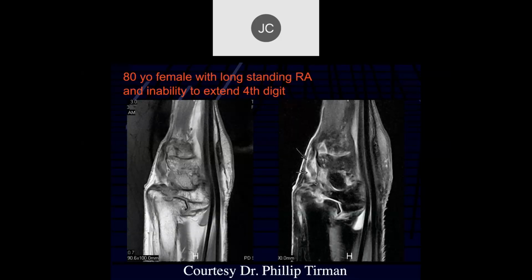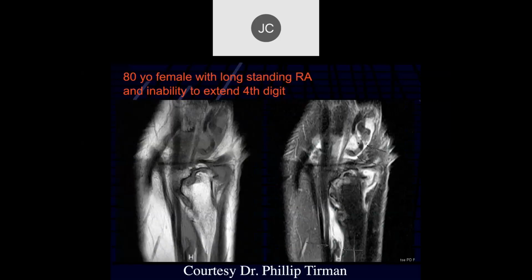Just like you saw in that previous case of Tayson's, you always just have to check a little bit to make sure it's not a vessel, which is pretty easy to do. If you follow distally and proximally, you can easily differentiate and also look for flow characteristics between tendons and the vessels. And then here you can see that it's retracted and coiled up, which is typical of a completely torn tendon.